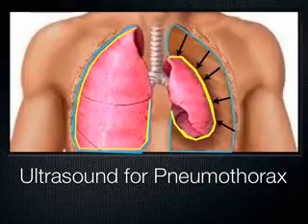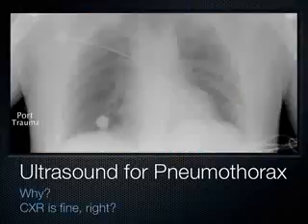So what about chest x-ray for pneumothorax? You have a patient who's short of breath. You get this chest x-ray. It looks like the lungs are inflated. It couldn't possibly be a problem, right?